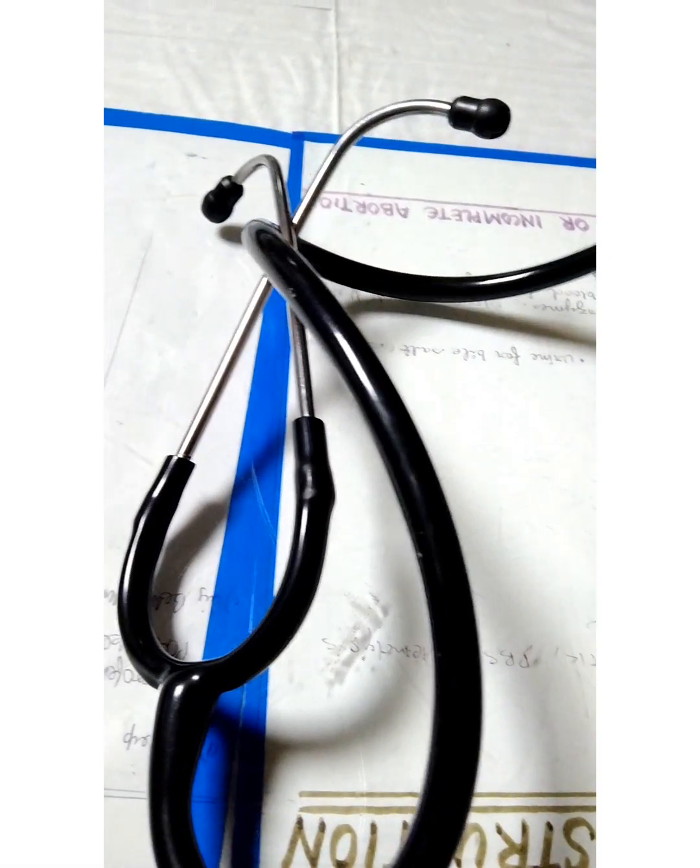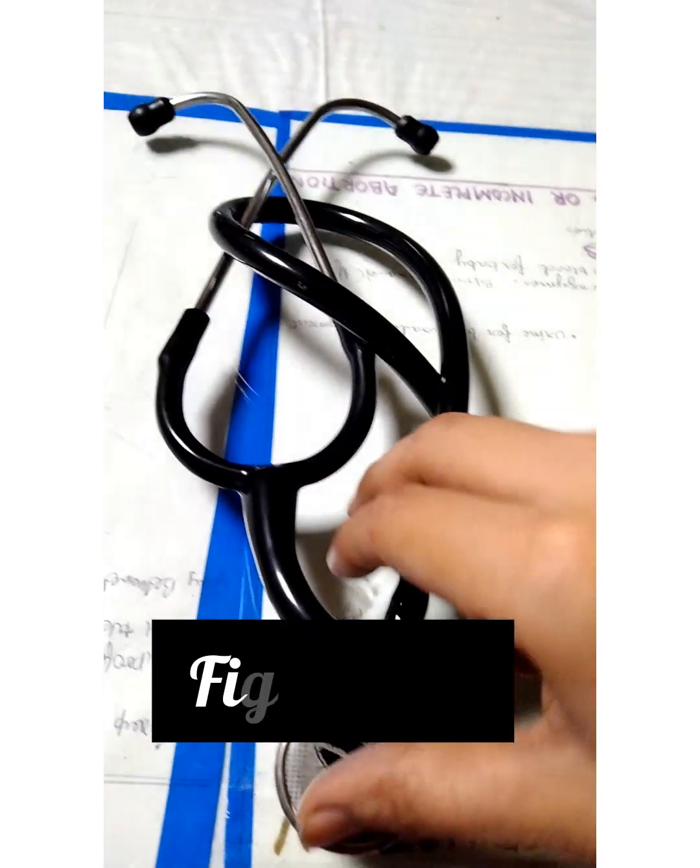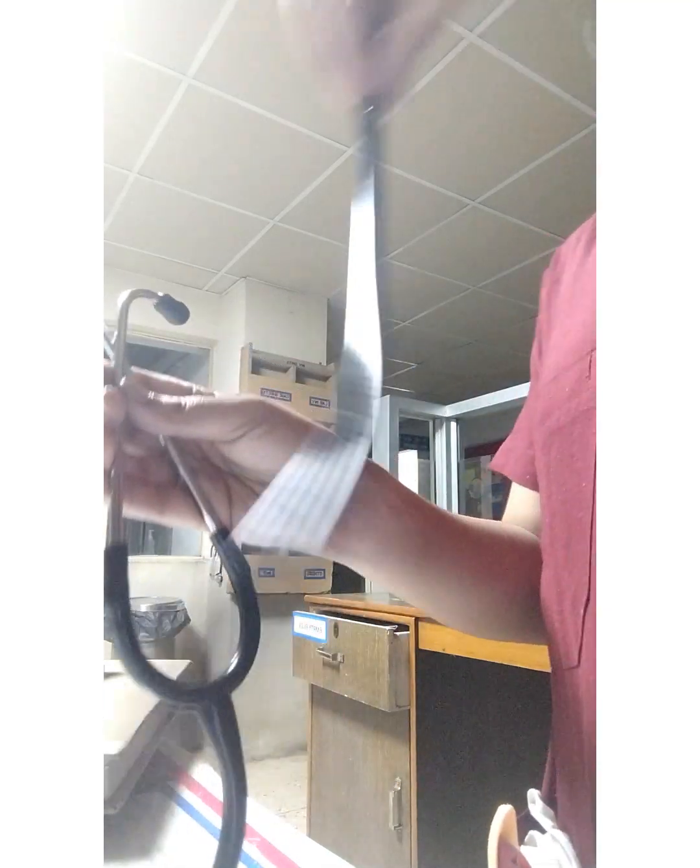First point is stethoscope should be placed in the shape of figure of 8. Here is the method of making figure of 8.